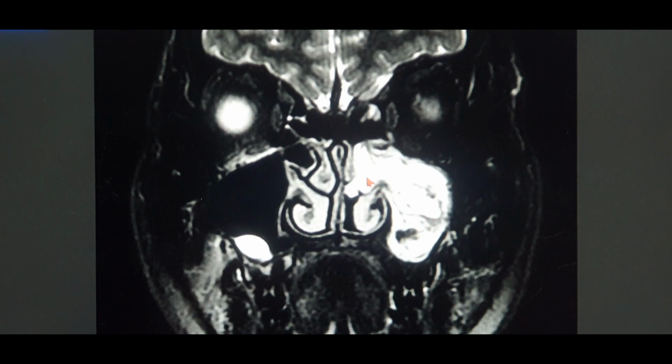If I take a biopsy from somewhere here, which is going to be polypoidal in the periphery area, this is going to be useless. So I need to take a biopsy from this region going into the maxillary sinus, and take a biopsy from this region and nowhere else.